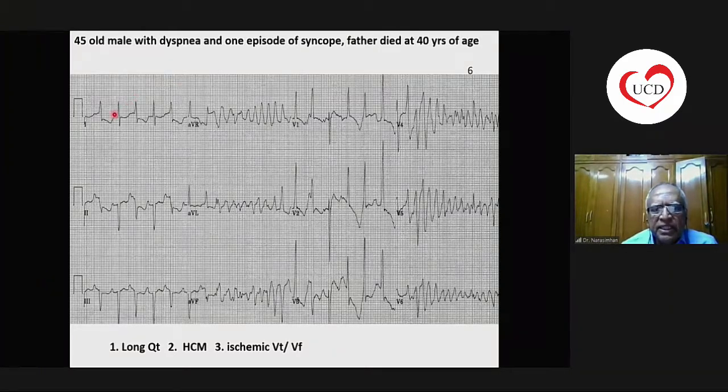This is a very typical example of ST-T alternans. Critical ischemia or global ischemia can cause this. When the ST alternately becomes too deep and less deep, too deep, less deep, this is a typical sign of severe ischemia. This can also be seen in patients with a very severe hypertrophied ventricle, a suicidal ventricle.